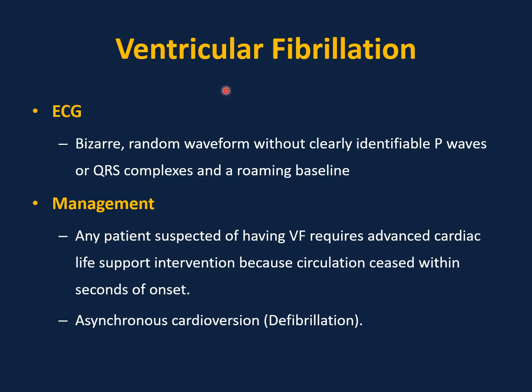ECG finding in cases of ventricular fibrillation: bizarre random waveform without identifiable P waves or QRS complexes, and a roaming baseline. Management: any patient with suspected VF requires advanced cardiac life support intervention because the circulation ceases or stops within seconds of onset. Asynchronous cardioversion is required in this case.